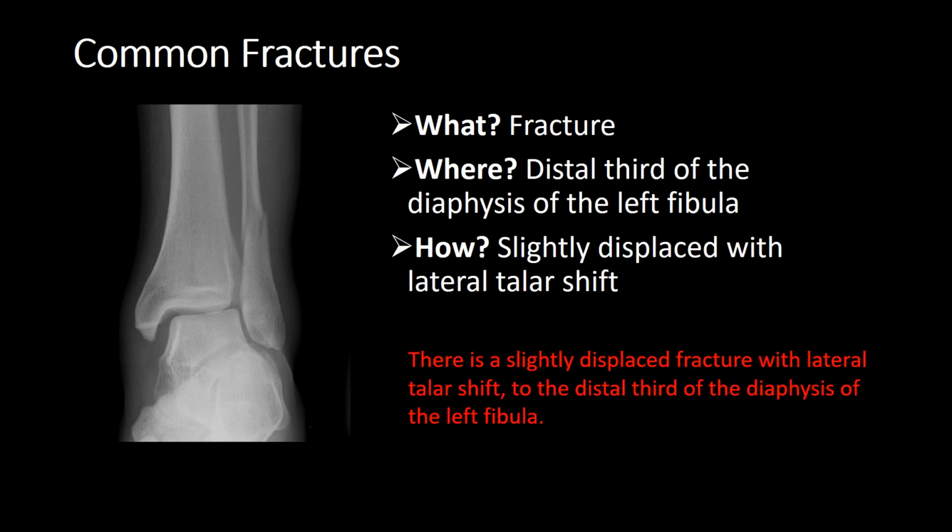So what is it? It's a fracture where it's the distal third of the diaphysis of the left fibula and how, it's slightly displaced with lateral talar shift.